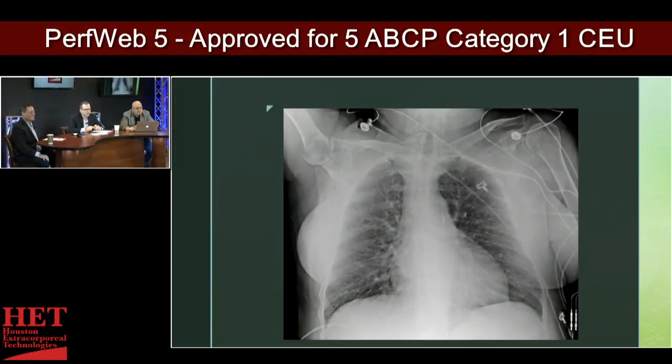So Patrick, this is a good film where the EKGs are not really obscuring anything that you want to see. And so you can look at the bony structures, you can look at the lung structures, and then we'll just skip to the end and go straight to the lines. And so you can see that this patient is not intubated. They don't have any central venous catheters that I can tell. They may have something in the groin. Mm-hmm. But if you look at the mediastinum, you see something that's unusual.